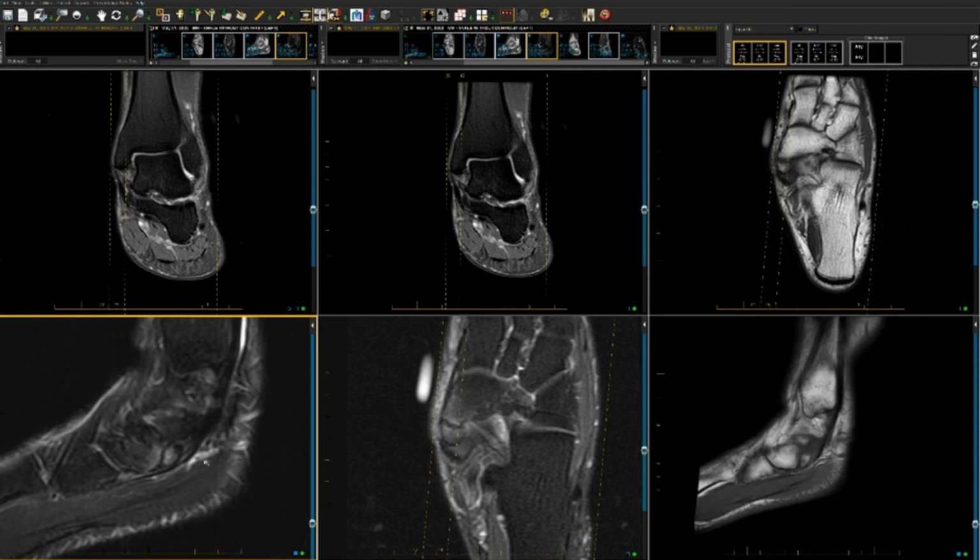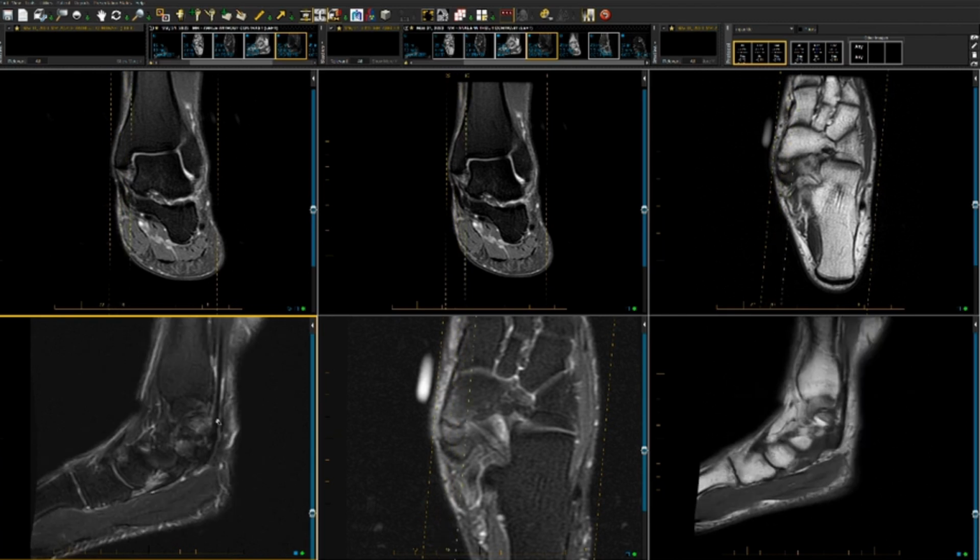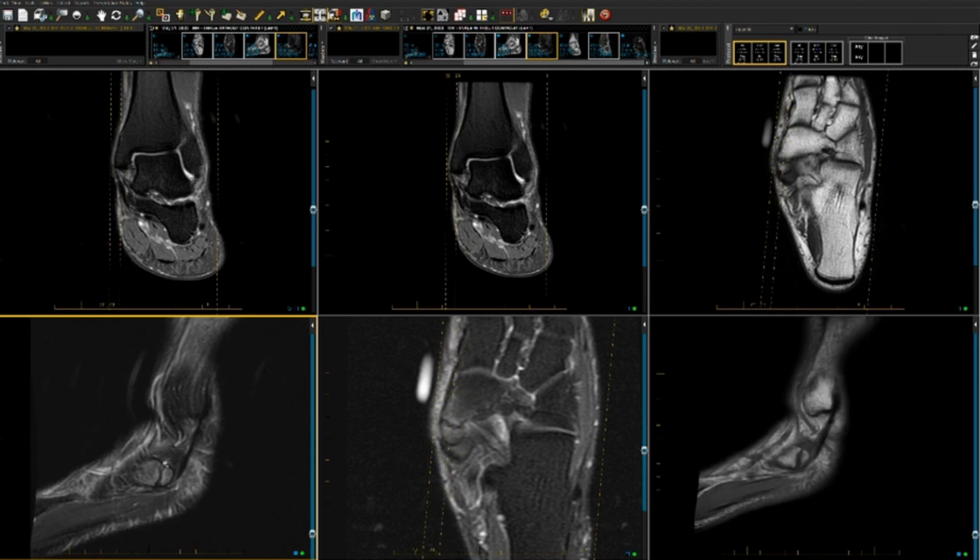Let's take a look at this sagittally. So we're watching the posterior tibial tendon come down, a small amount of tenosynovitis, and then we can appreciate its attachment on this os navicularis with its curved synchondrosis with no edema within this synchondrosis, but there is edema across, indicating there's been a stress response.